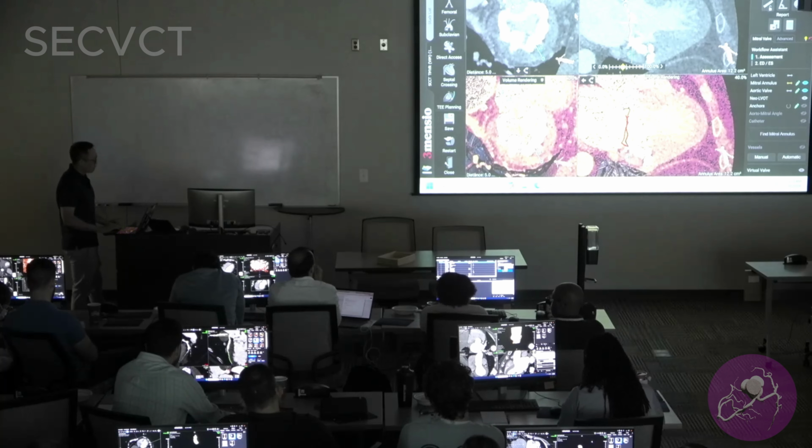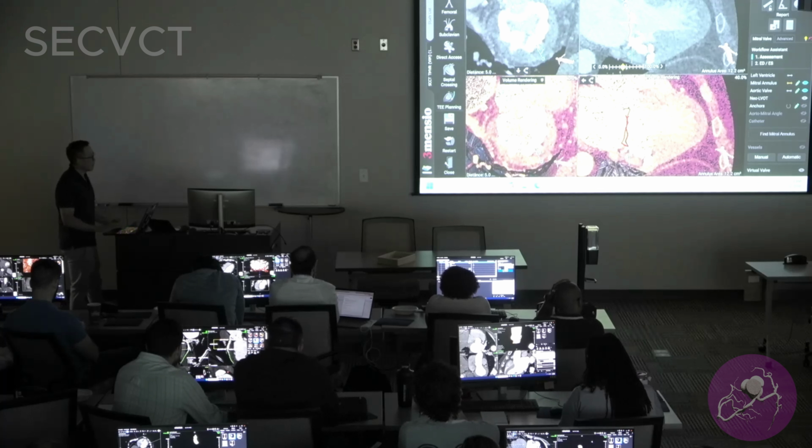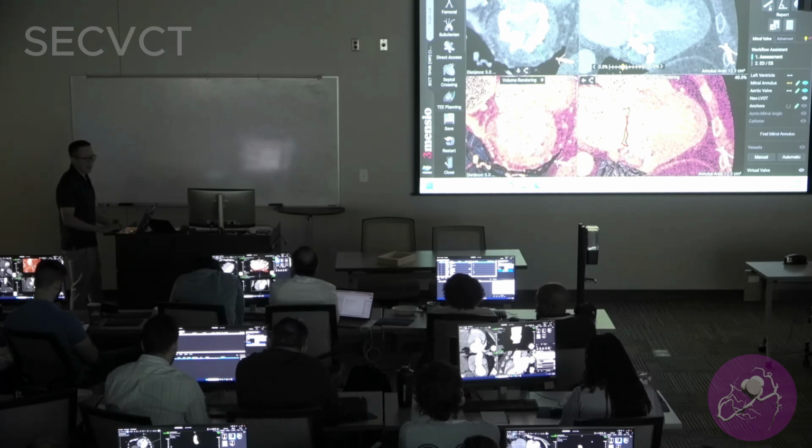This was one where you can obviously see there's 100% circumferential mitral annular calcification. This is not always the case. Actually, probably the majority of the time, we'll see someone with MAC, but maybe it's only encompassing 50% or 60% of the annulus. There may not be MAC on the medial side or the lateral side. And the cases where there's circumferential MAC are actually somewhat easier, because if you put a valve in here, it will hold in the middle.